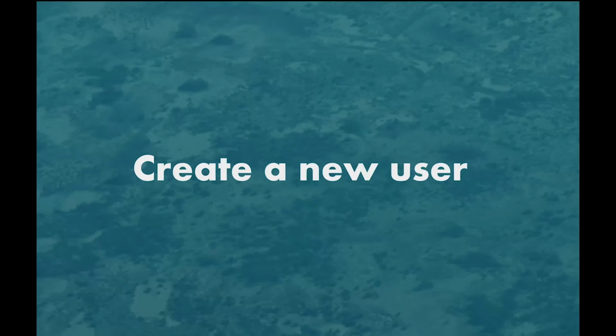I'm going to walk you through how to create an account in Limbase, but I do want to take this opportunity to remind you that Limbase is a clinical decision support system for lymphedema therapists. There's an expectation that you've completed lymphedema-specific postgraduate training in the management of lymphedema in order to register as a Limbase user.